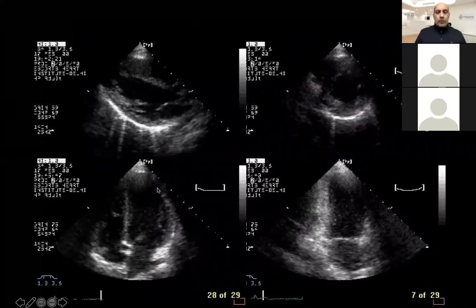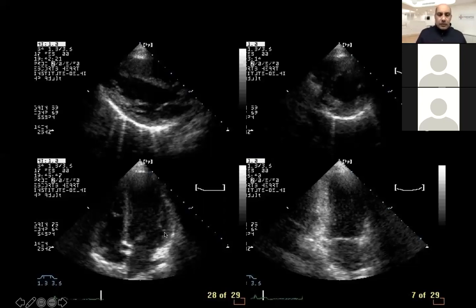I showed these four pictures here. Let's focus on this. This is anterior septum, basal anterior septum, mid anterior septum in a parasternal long axis view, right? This segment is basal posterior, and many of us would rank this as mid posterior, right? Same way, this would be basal and lateral, mid-lateral, papillary muscle is seen here in the four-chamber view, apical lateral, apical septum, mid-septum, and basal septum.